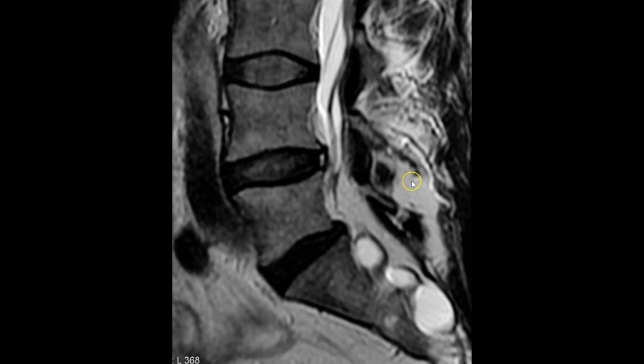One of the more common pathologies, so to speak, that you'll see in the intervertebral disc will be a bright spot in the posterior annulus. So it's important we know the terminology surrounding this. This is most appropriately called an annular fissure, which is just separation of the outer fibers of the annulus with some fluid extension in between the two. Other terms you might hear for this are annular tear, which is a little bit harsh of a term to use, or high intensity zone, which is probably more appropriate. It's just a bright spot in the back of the disc.